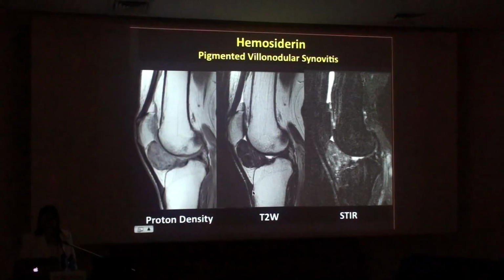But this is a nice example, if we move over to the fat-saturated T2 weighted image, that on this image, the lesion isn't so dark. So if you looked at this, you'd appreciate that subtle amount of edema that's within it, whereas it's really the T2 signal that we're focusing on for the analysis that we're trying to make.